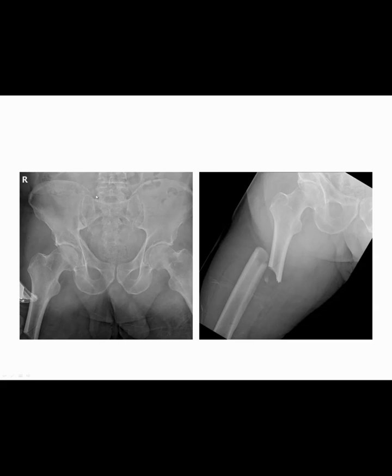When you're assessing the cartilaginous spaces, think of the sacroiliac joints, and look for any abnormal widening or increased sclerosis. Look at the symphysis pubis for any diastasis or abnormal widening, and assess the acetabula bilaterally.